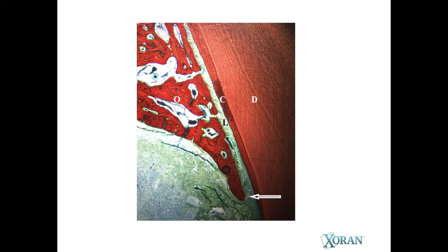And as we can see here, the bone peak is also very thin in this most coronal aspect of it. So this coronal bone is very thin. It usually is somewhat dense, but it can be very, very delicate to the point where it's difficult to see on a radiograph, and it's difficult to see on CT scanning, such as cone beam CT, because of the width of it. It also happens to be close to very dense tissues, such as the dentin and the cementum, and as a result, we might lose the image of it right at the tip of it.